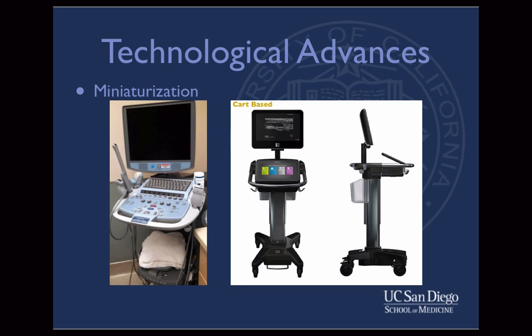Over the years, advances in technology have also enabled manufacturers to market machines with newer software features, increased machine durability, and smaller size. Here are some examples of cart-based systems, which are often used in emergency department and various hospital clinic settings.